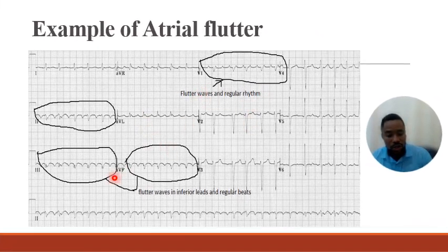This is an example of atrial flutter. You can see that everything is looking like a sawtooth shape. Like if someone should take this to cut your hand off, like all those orthopedic surgeons. A joke. So this is looking like a sawtooth. There's no isoelectric period there. You can say 2 block, 3 block, and all that for this.